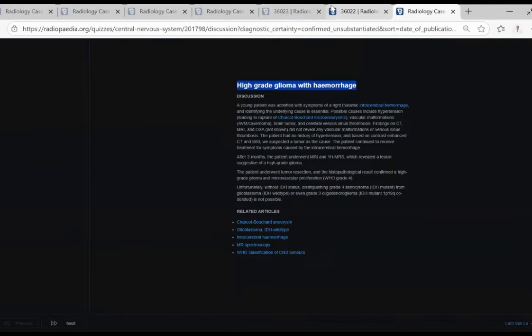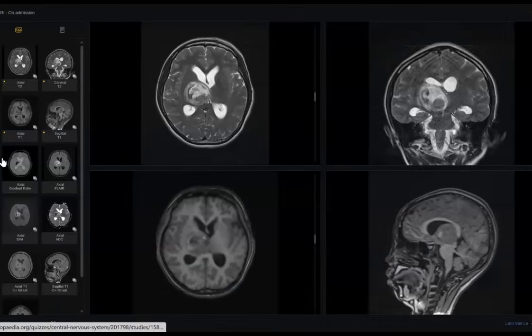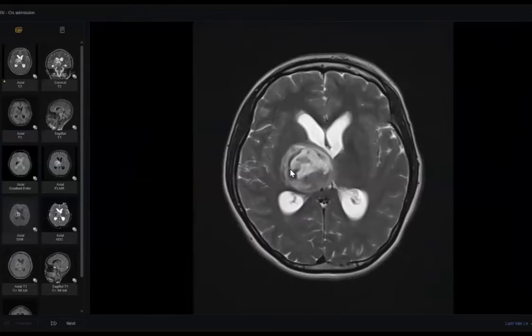Again, I will revise what happened. This case was an intracranial hemorrhage due to a hemorrhagic space-occupying lesion. The case before was a hemorrhage due to hemorrhagic venous infarction. So don't be satisfied with just searching when you are presented with hemorrhage.